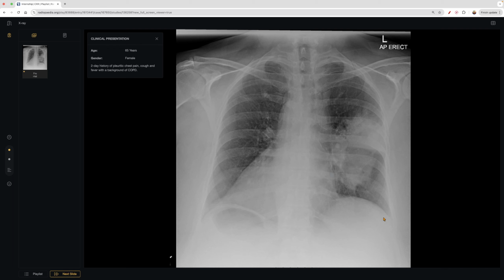So we come down, and I haven't been talking about it because the video would be too long, but we don't see that gastric bubble anymore. So that's interesting. But we come across the right side, and we do see that gastric bubble. And oh, by the way, the heart is also pointing in this direction. So what do you think could cause this?